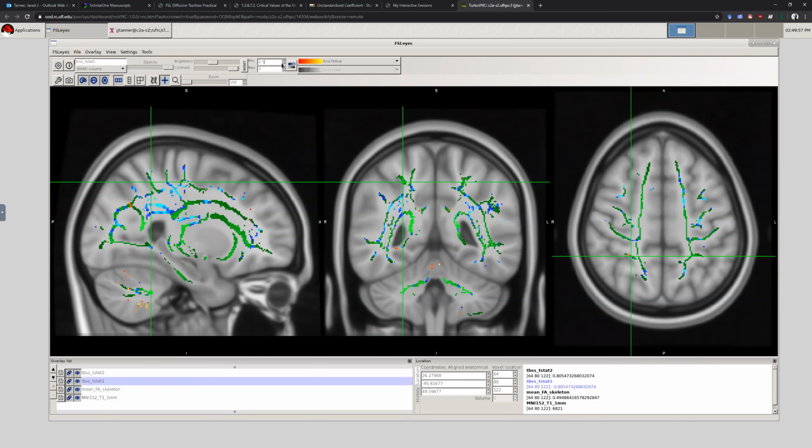2.16. Now we've been a little bit more robust. So these are data that with a small sample size, if we're talking about these as pilot or preliminary data, I would be a little more comfortable with publishing. Certainly this would be great for a grant submission saying, here's some possible evidence of some differences.